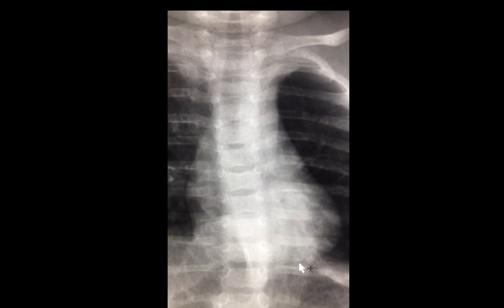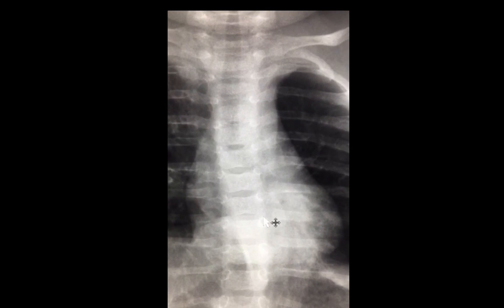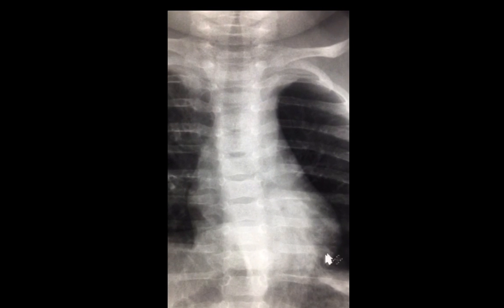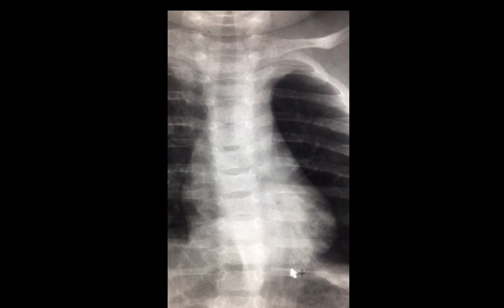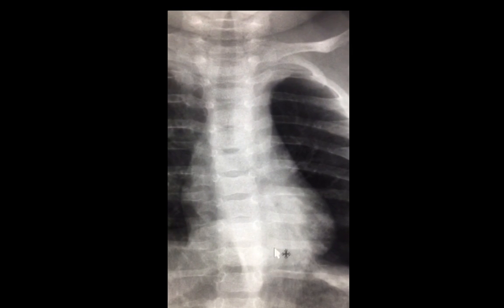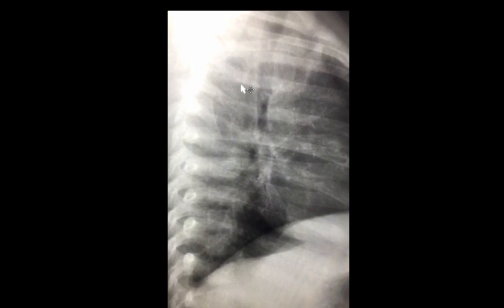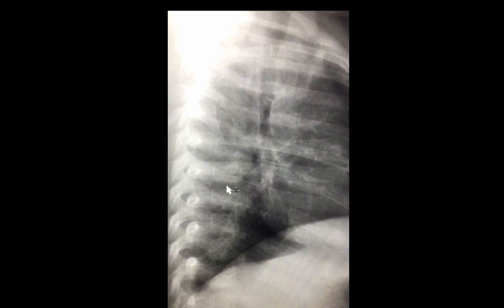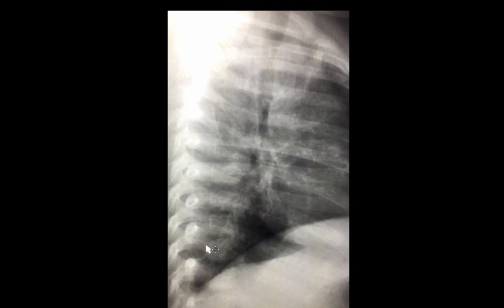So we learned from this case of left lower lobe pneumonia 3 big things. First, the density on each side of the midline, especially in the retrocardiac region, should be equal. Second, the diaphragm should be well defined, and if you see obscuration, this is a positive silhouette sign. The density over the spine on a lateral chest radiograph should decrease from above below, and if that's not the case, this is a positive spine sign for lower lung abnormality.